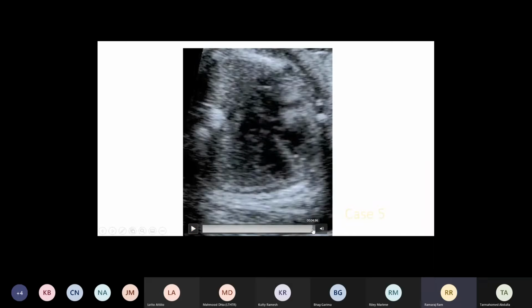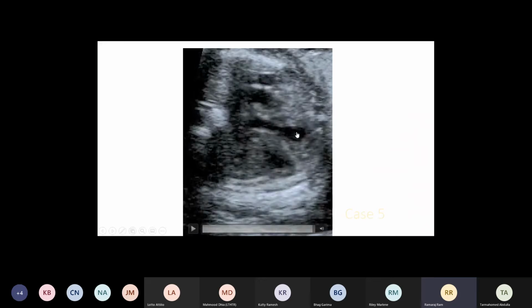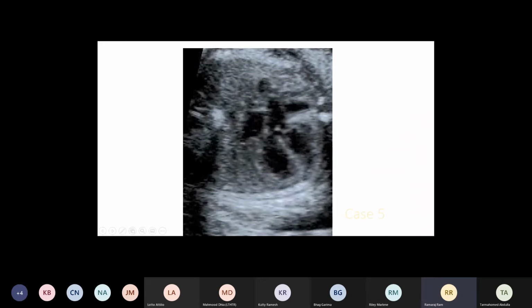You have one more example, probably. I don't think so. Yeah, that's a pulmonary artery. It's a normal crossover. So here is a Fallot's, I think, this one.